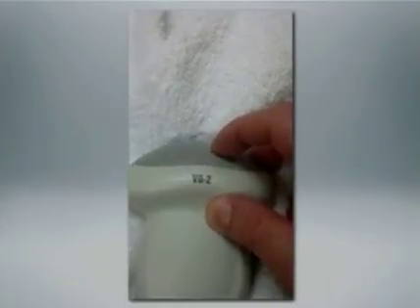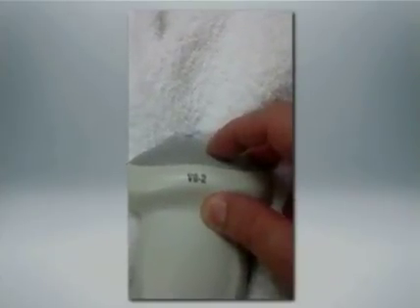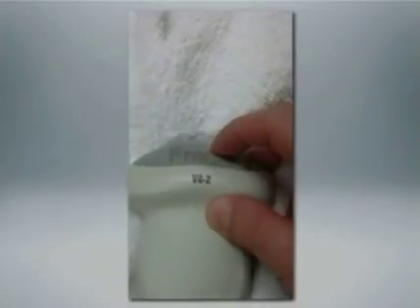And you can see that because of that, the face of the transducer is not completely rigid as it is with most of the probes that we're used to using. And as I activate this clip, if you look carefully, I was pressing on this actually fairly lightly. You can see the face of the transducer deforming slightly with each press of my finger. And I promised I wasn't harming this transducer. Again, my second disclosure, it was working just as well after I finished this clip as it was before.